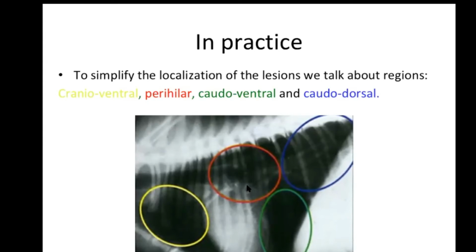Like if we have edema in the dog, so like fluid from heart problem, we will see it in this area. Not in this, not in this, not in this, it's going to be here. Sorry. So this is called the perihilar area.